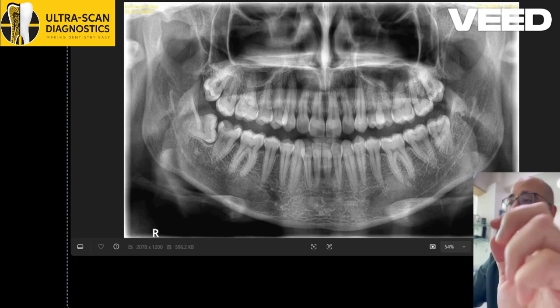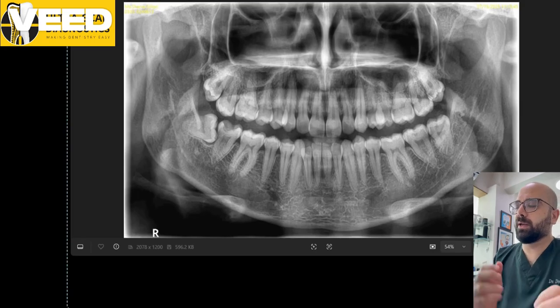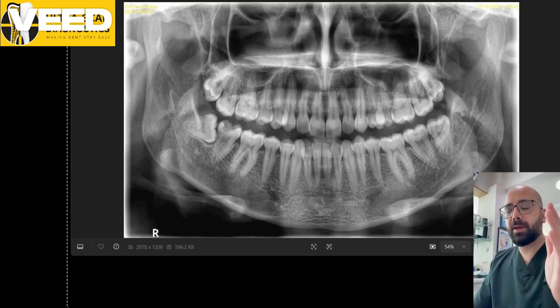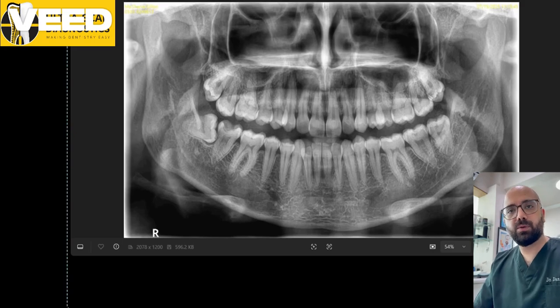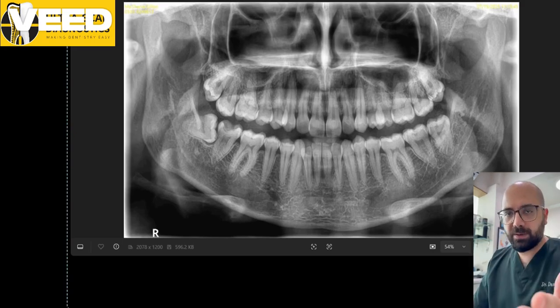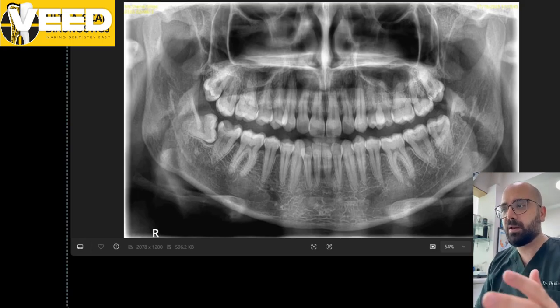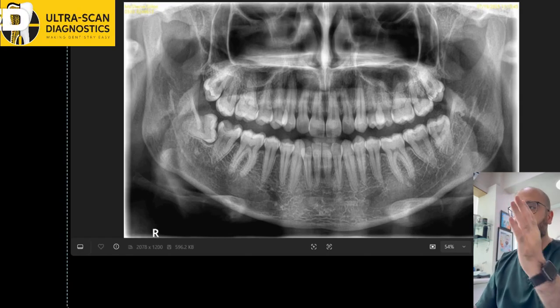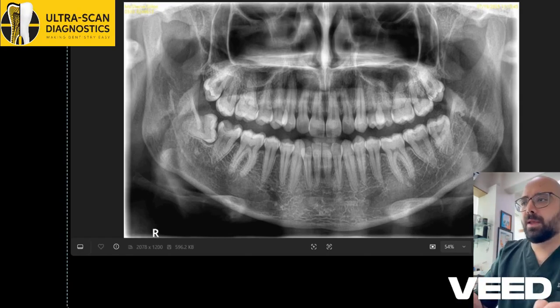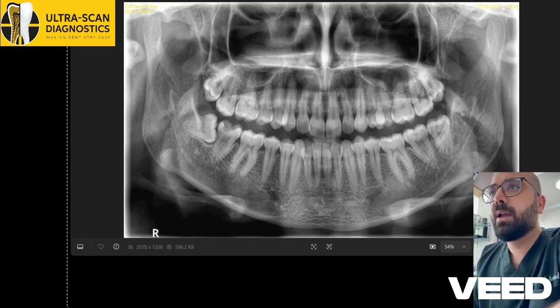This is an absolutely fantastic episode about how we are going to correlate 2D X-rays and how our AI software analyzes those 2D X-rays, and then we're going to compare those results with the gold standard, three-dimensional CBCT. The OPG will be analyzed by the AI, the CBCT will be analyzed by me, and we're going to check and verify if the AI software actually found all the pathologies and if they were accurate enough that the 3D also got it. Without any further delay, let's start with this particular X-ray.